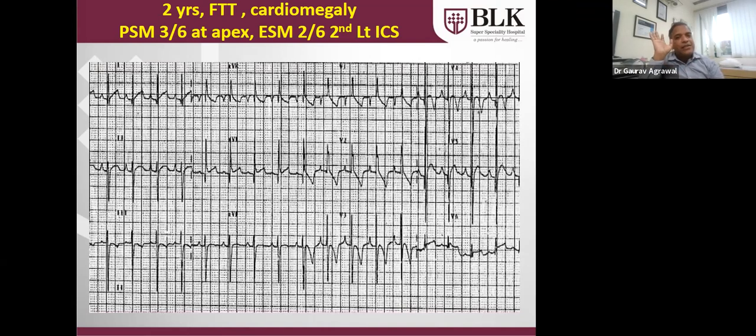This is a case of ASD. I am telling you the diagnosis. But what type of ASD you have to decide by seeing the axis. You have to find out lead 1 and AVF, and let me know what is the axis.